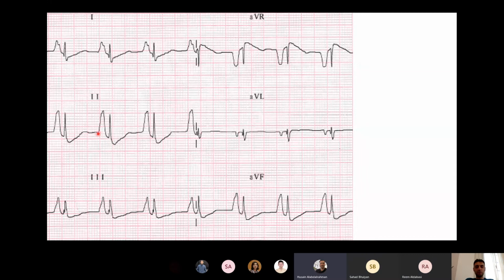Abnormal. Right. So this is obviously a super tall P wave and a wide P wave. This is roughly 3 small squares, so it is wide, but definitely very tall. And then there's an indentation in the P wave.